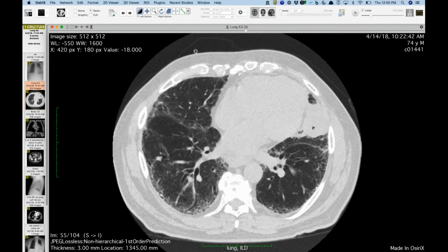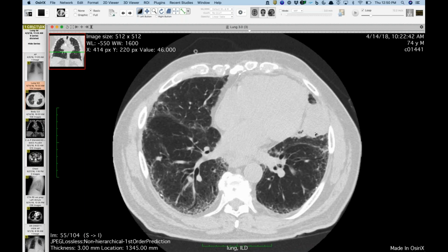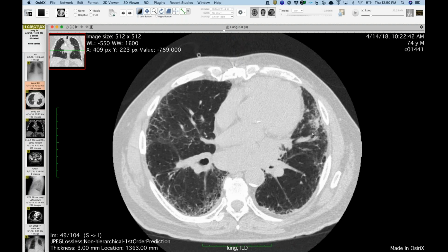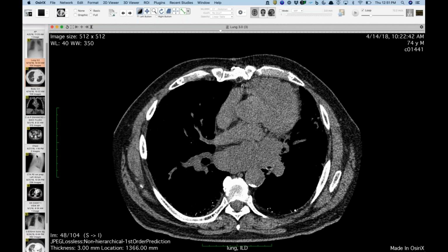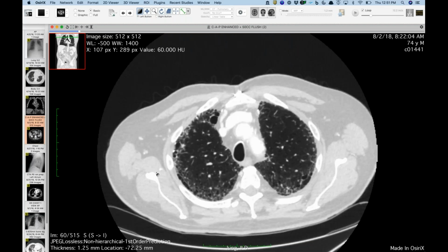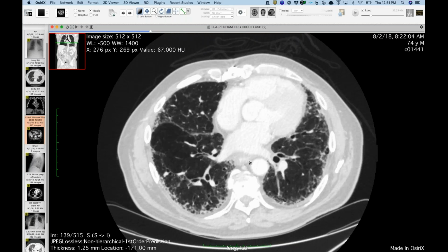And of course, as we know, these patients are subject to increased risk of lung cancer. This was actually some sort of neuroendocrine carcinoma when it was biopsied, and you can see the patient had bulky lymphadenopathy. So this was April of this year, and with his metastatic disease, you can see there's probably a little dendriform ossification as well. Not a surgical candidate, but you can see a few months later that he's undergone chemo and radiation, and you can see just a really great response.